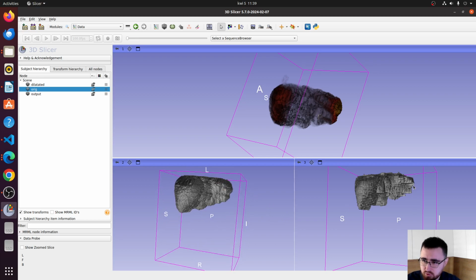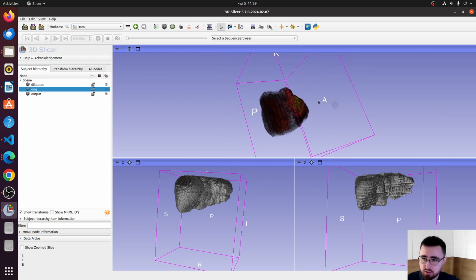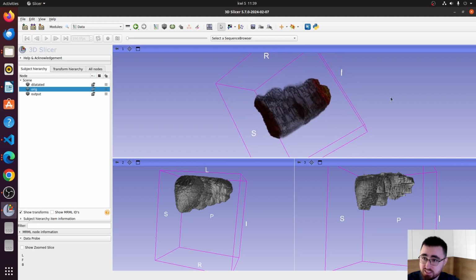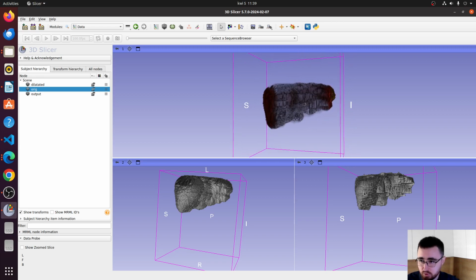The situation is different here. When we have the very peak of the liver in this area, at least in this 3D representation of it, we see that there is nothing up, nothing down, nothing back, nothing in anterior. We have only some voxels to the left. So any dilatation in this direction would lead to the situation that we do not have anything close in the 3D distance. Hence, this is the situation that we see. So we see that those voxels are far more distant than any other, and voxels in the hilum are very close to some other voxel. Okay?